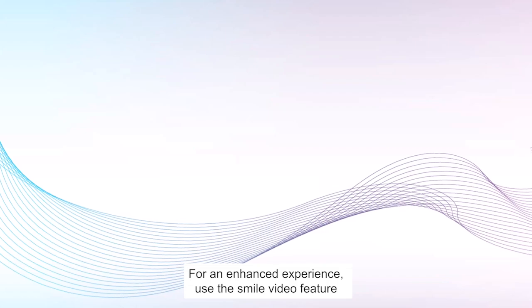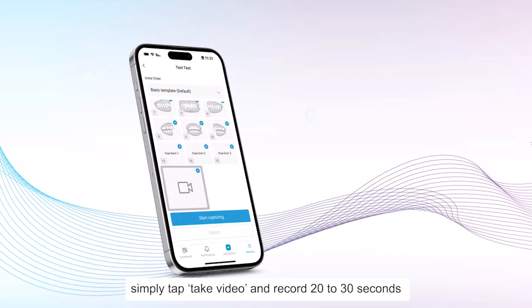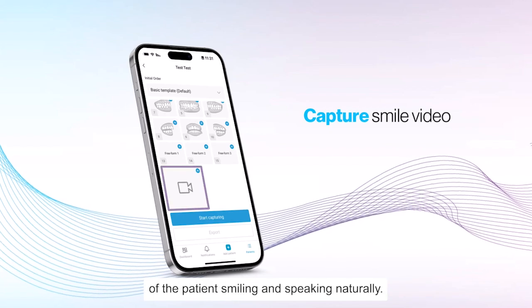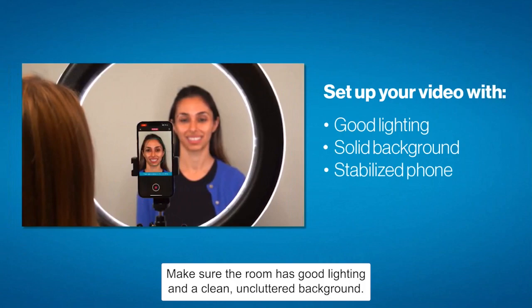For an enhanced experience, use the Smile Video feature. Simply tap Take Video and record 20 to 30 seconds of the patient smiling and speaking naturally. Make sure the room has good lighting and a clean, uncluttered background.